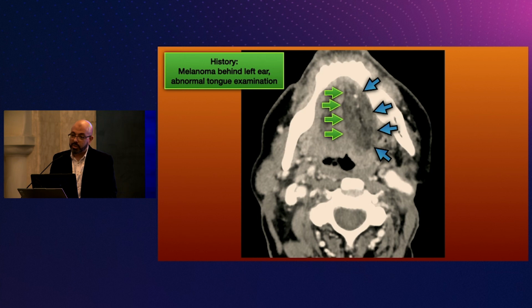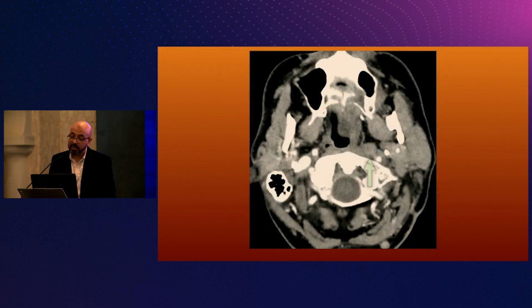But why is that? You need to check the whole area from the brainstem till the level of the hyoid. And that's the problem here. The RP node going into the carotid space causing nerve number 12 palsy. We said that this is the closest nerve to any RP node.